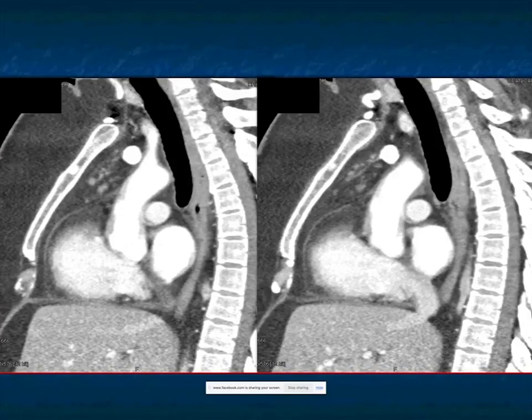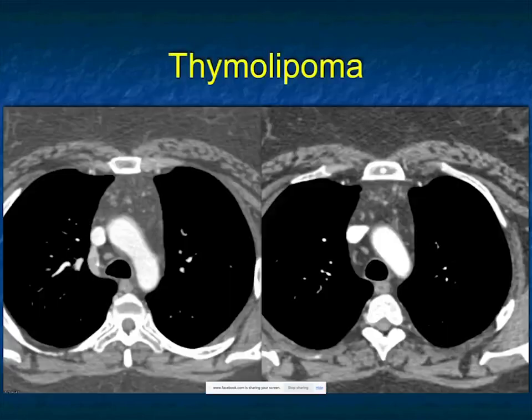And when you're thinking about thymic infiltration, you also got to consider a thymic lipoma, which this was, a thymolipoma. Thymolipoma. Again, could look just like infiltration of the normal thymus by fat. Thymolipoma. Benign, leave alone lesion.